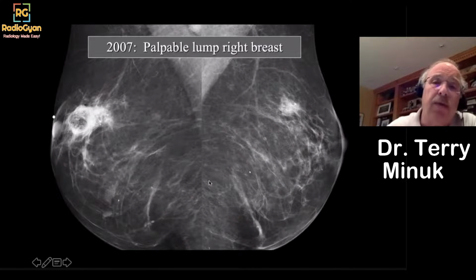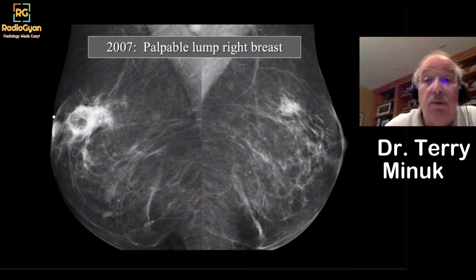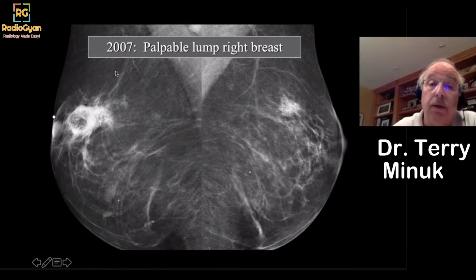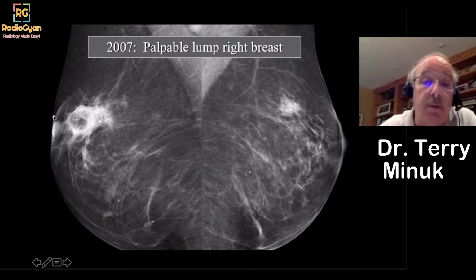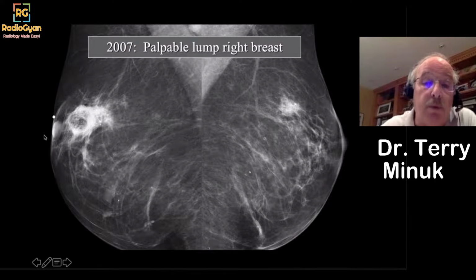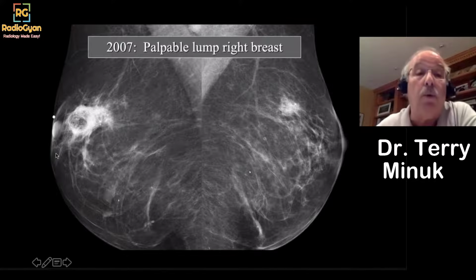And this is a case where we make mistakes and we don't want to. This is a lady who had breast reduction surgery and a couple years later develops a mass behind her nipple. And this is really common with breast reduction surgery. The nipple has to be reimplanted to be in a normal position because with breast reduction surgery, the nipple ends up at the bottom of the breast and they retransplant it to be in a normal position.